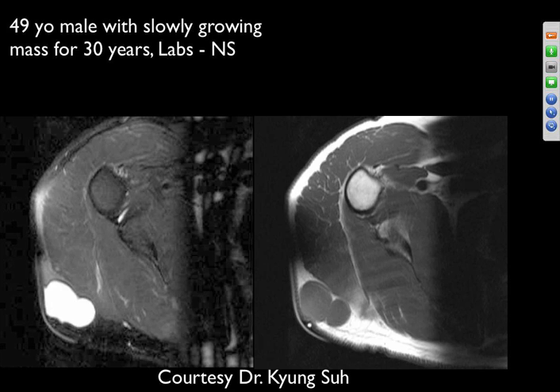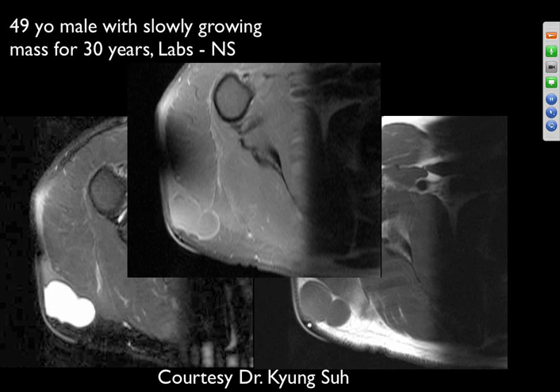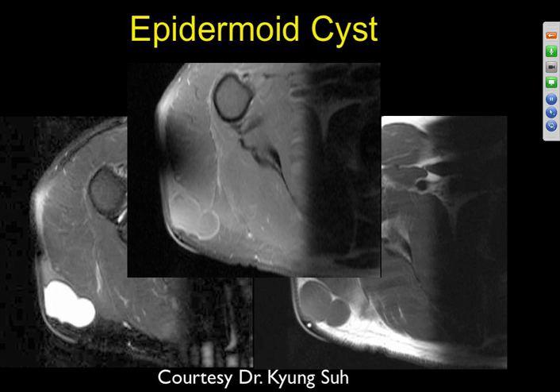Okay, Philip? A 49-year-old male with a slowly growing mass for 30 years. It looks like a T1 hypointense, fat-sat hyperintense mass in the subcutaneous tissues. It looks like it should be cystic. Post-gad demonstrates no enhancement, so also likely a benign sebaceous cyst. Yeah, this was an epidermoid cyst.